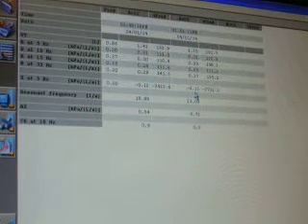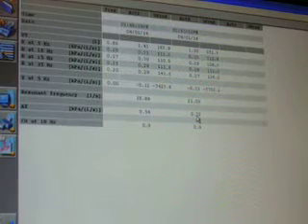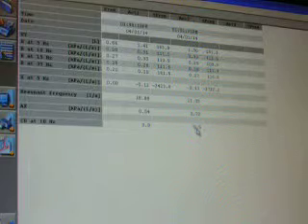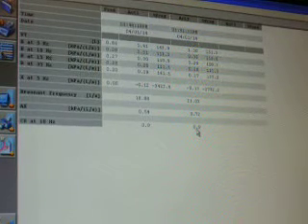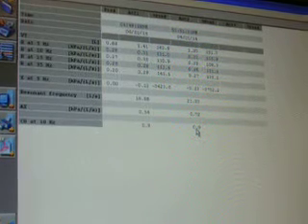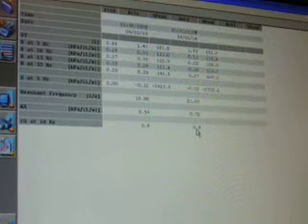Same with the second one. X at 5 Hertz is negative. We have an AX value, and the CO at 10 Hertz is above 0.8. So this is an acceptable maneuver as well. So we have 2 acceptable maneuvers. Remember, we would normally want 3. We want to know if these values are repeatable.